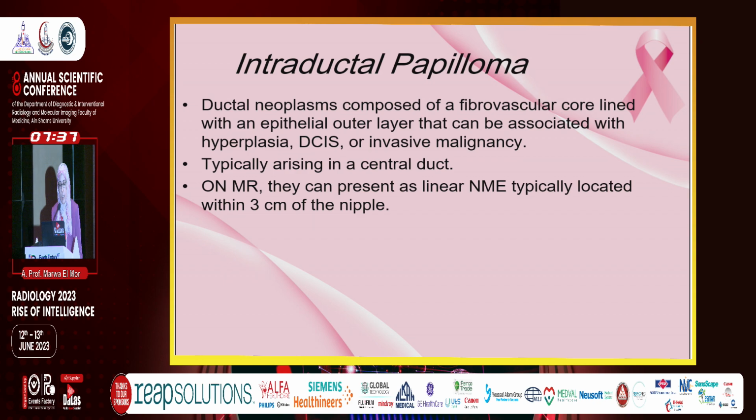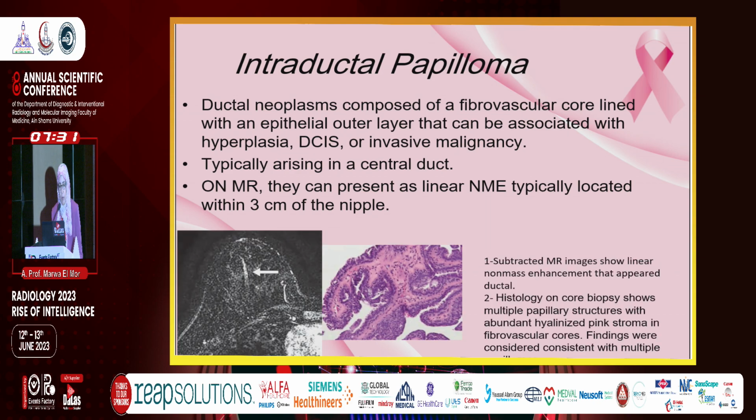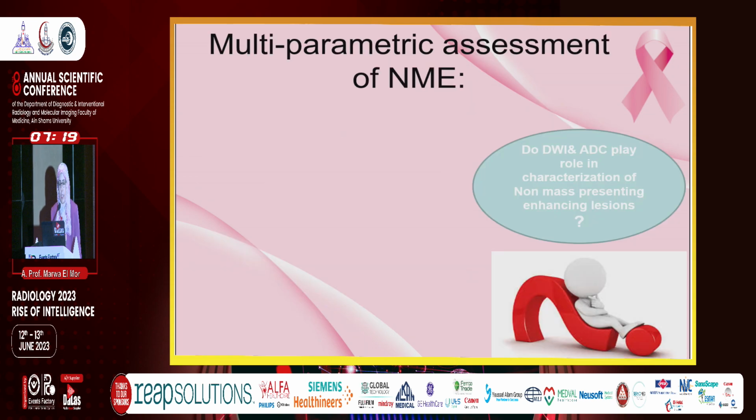On MRI they can present as linear non-mass enhancement, typically located within 3 centimeters from the nipple. In this case, there is a linear enhancement seen within a central duct, and on biopsy it was found to be multiple papillomas.